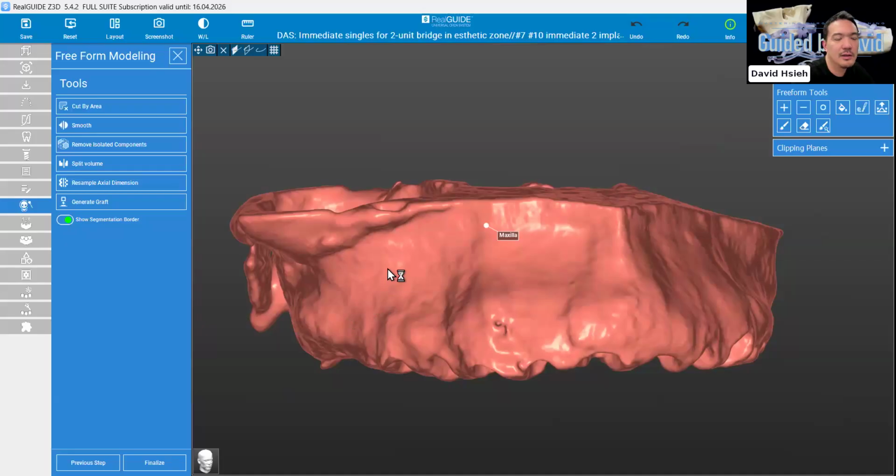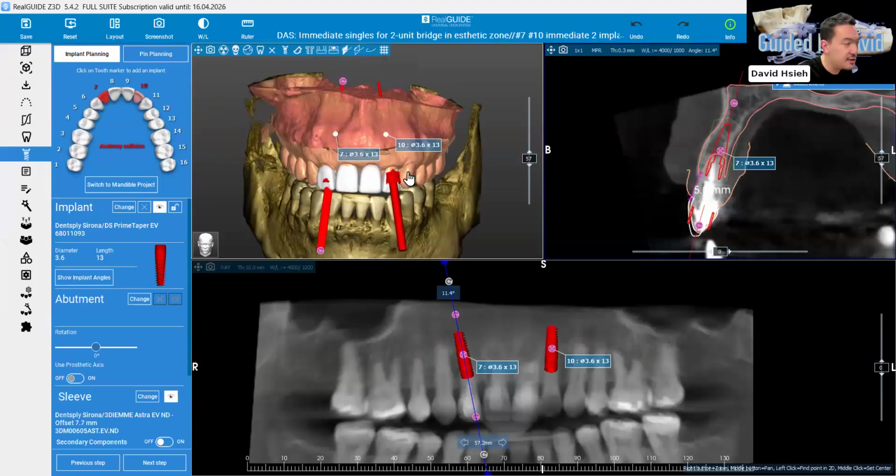All right. So we have the full model here, right? Just so we can visualize, right? We don't need to do this part. This is just my working preference. It makes my life easier because I can visualize what is happening.